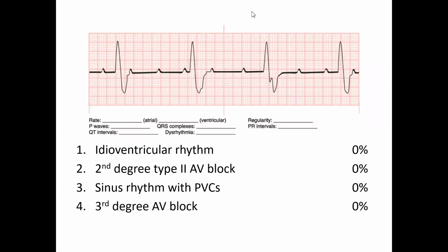So now let's look at this particular rhythm, and we'll see that you have more P waves than you do QRS complexes. So we have a relatively slow ventricular rate. Our ventricular rate stands out pretty quickly. It's 40, utilizing the 6-second method. Our QRS duration, if you look here, is right at 3 boxes, 0.12 seconds. So we'll call our QRS duration 0.12.